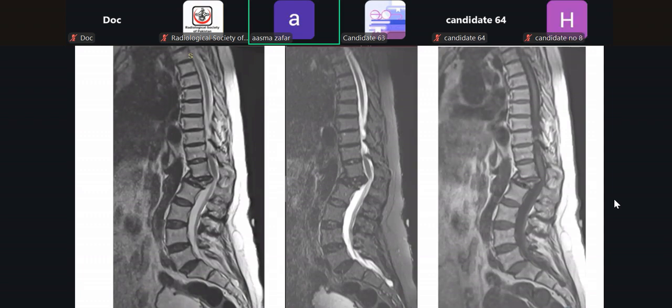Actually, the catch was the urinary bladder. Look at the walls. Yes, ma'am. These are trabeculated. Yes. So neurogenic bladder. Yes, post-traumatic.